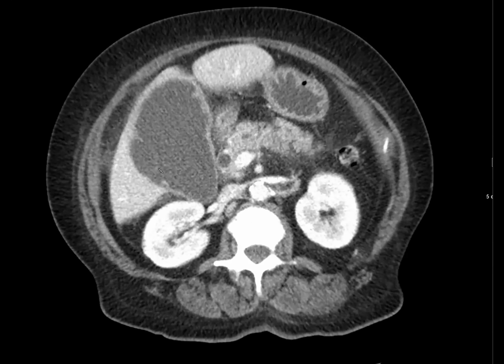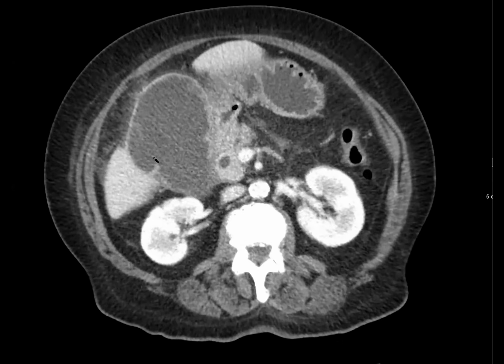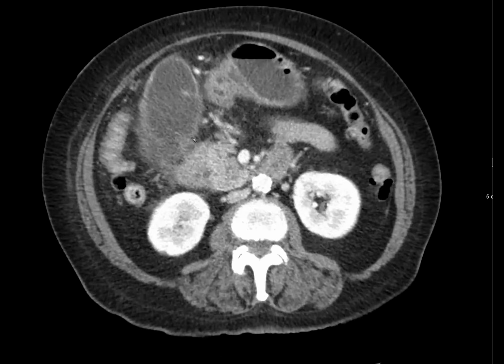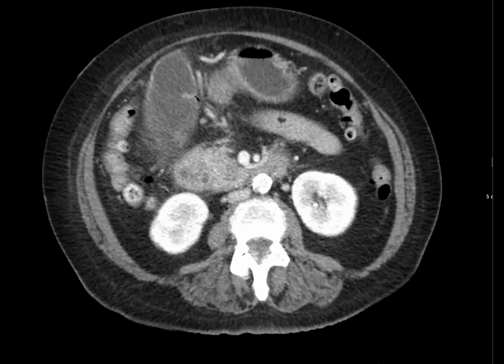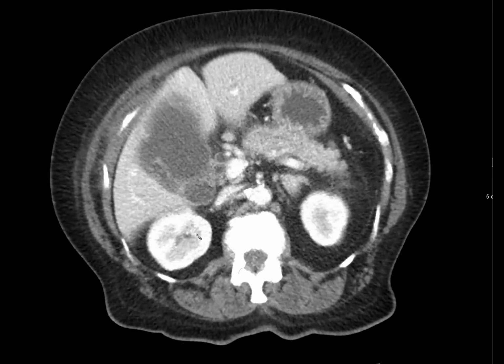I was also concerned about whether it is gangrenous, because is the wall falling apart here? Is it a contained perforation? There's obviously inflammation around it. We also contemplated whether this could be xanthogranulomatous cholecystitis, where you can get cystic spaces in the wall, but the wall itself wasn't very thickened, so I was leaning away from that.